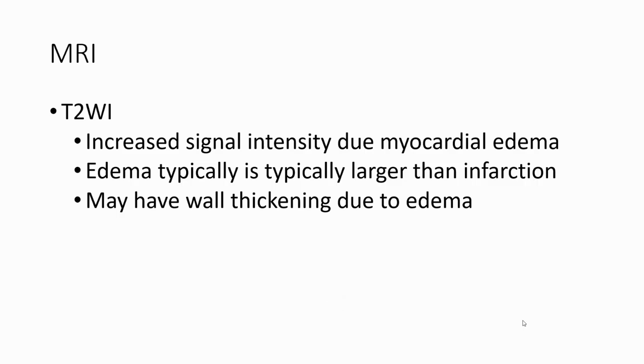T2WI. We will see increased signal intensity due to myocardial edema. Edema is typically larger than infarction, and may have wall thickening due to edema.